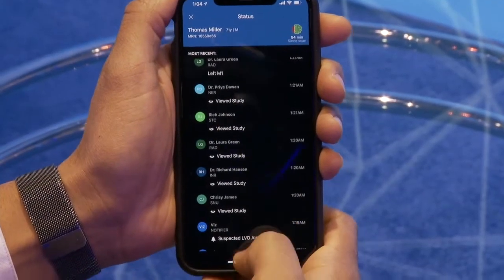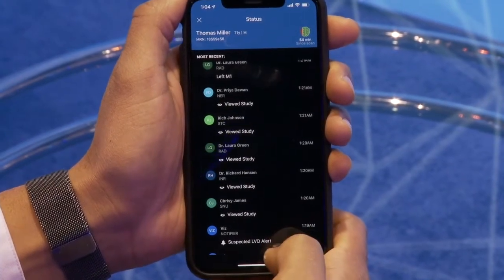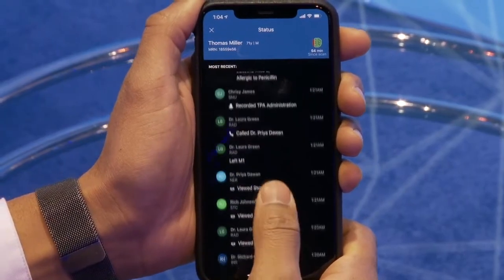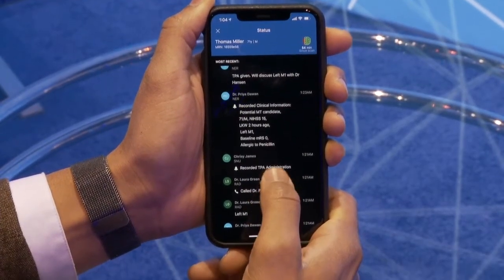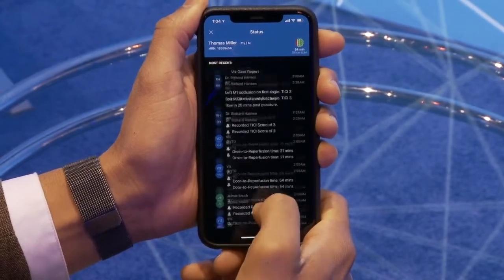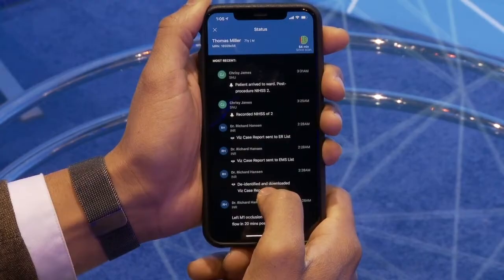I challenge you to identify another area of healthcare where you have over 100 years of clinical experience, all focused on one patient, moments after imaging has been completed and processed. If I continue to scroll, I can see when interventions have been administered. Here, IV TPA was recorded. I can also see clinical information about this patient. All the way through their procedure being completed and them being sent to the ward for ongoing care.